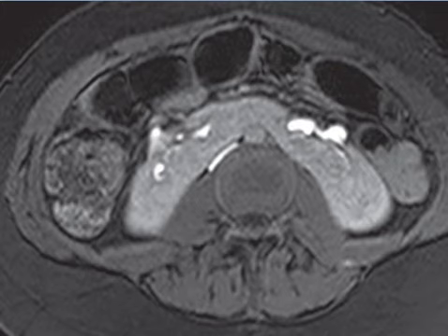Here, as we see in this axial T1 weighted imaging MRI with fat set, there is a fusion between both kidneys at the midline below the level of the inferior mesenteric artery in that area, and both kidneys are mal-rotated as we see here.